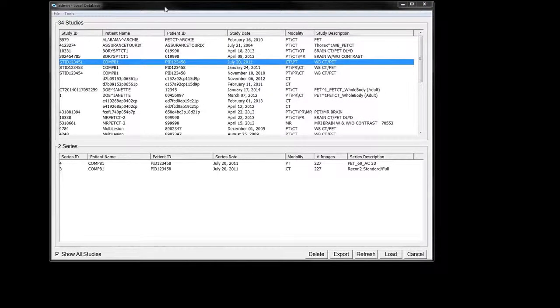In this video, we will show how to do study comparison within the UniSyn image fusion application. Here, in this case, I have 3 studies, and what I've done offline is I've created max SUV measurements, volume measurements, max diameter measurements on the 2 prior studies.